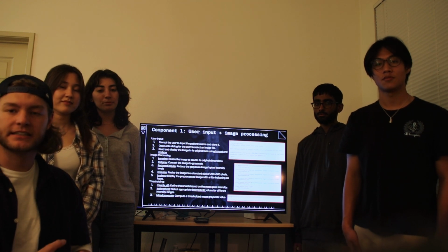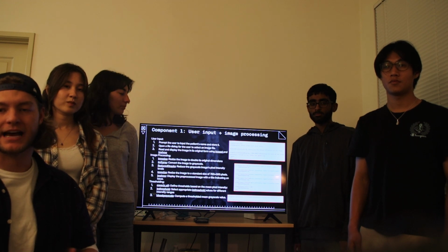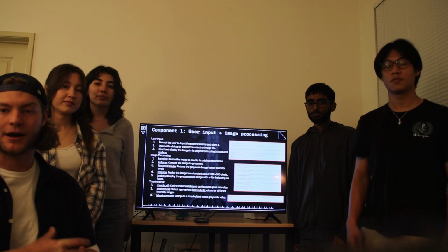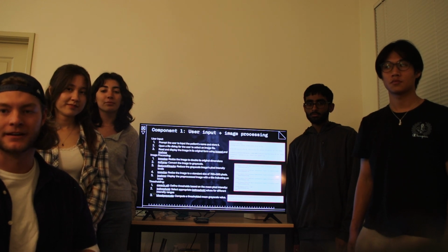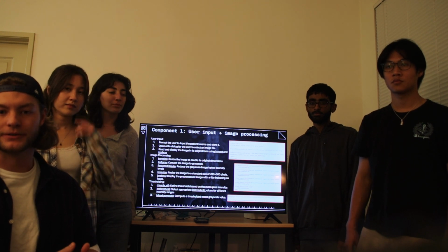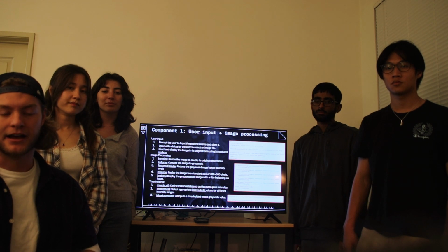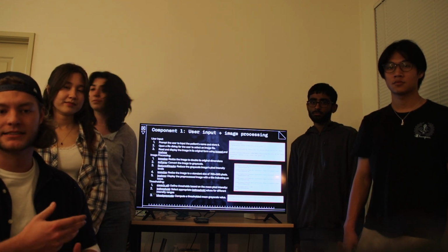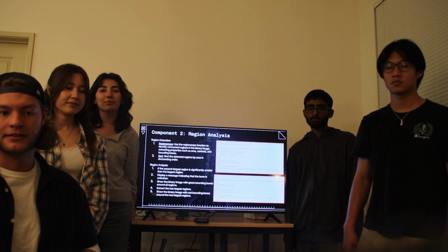All right, so we originally tried to do an advanced threshold that could adapt to all sorts of different images. However, the information stored in just one image proved far too great for our simple toolbox of tools. So instead, we went with a single thresholding technique using if-else statements to find the best grayscale intensity for our images.